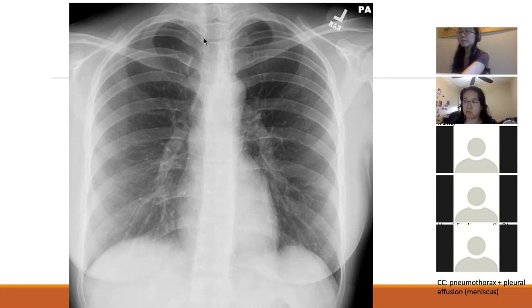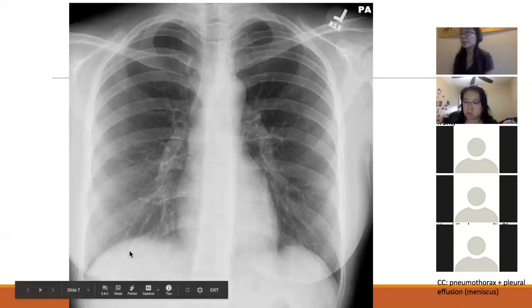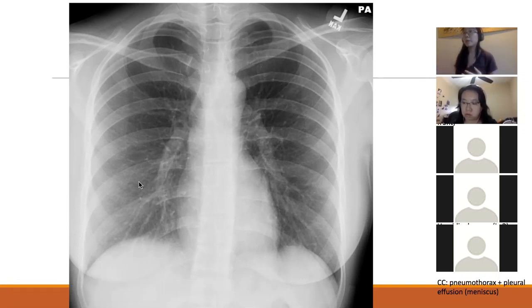So the mediastinum, this structure here, is going to deviate towards that pneumothorax if the right side was collapsed. And then the diaphragm is going to move up on that same side. In the other case of pneumothorax, that would be not your spontaneous, but the traumatic pneumothorax or the tension pneumothorax. Then what would happen is that, generally that's in patients with a history of trauma, doesn't generally happen spontaneously.